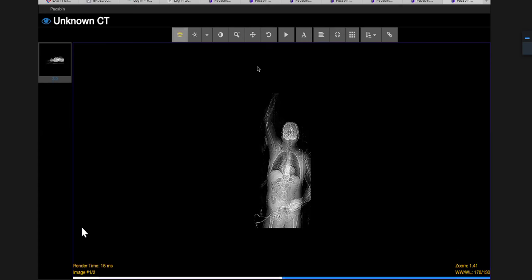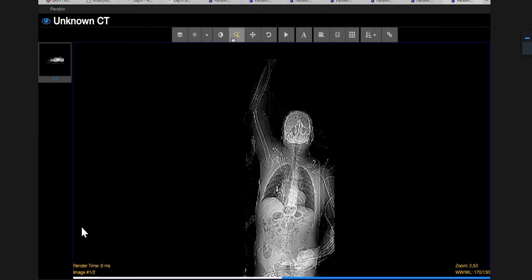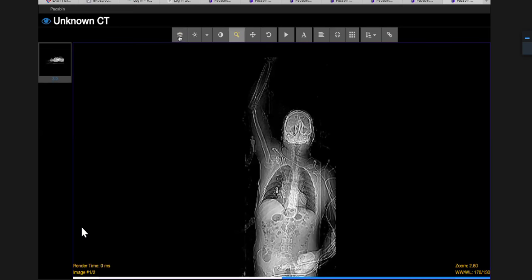So it's a bit of an unusual appearance. Imagine looking at them from the end of the bed. They'd look quite strange. So what is going on there, which is causing him to look like that? I think I know. I think it's this here. There is, oh my God, an inferior shoulder dislocation.